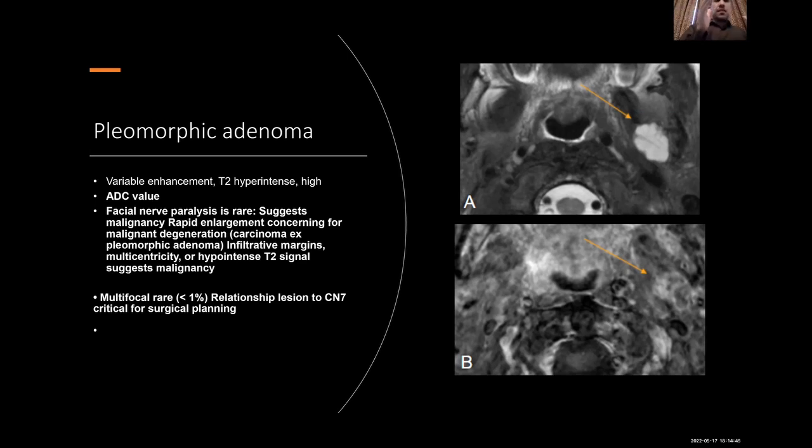When you say pleomorphic adenoma of the parotid gland, remember T2 hyperintense, T2 hyperintense, and variable enhancement, not low ADC value.